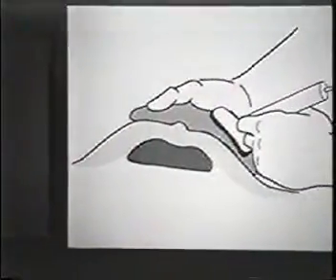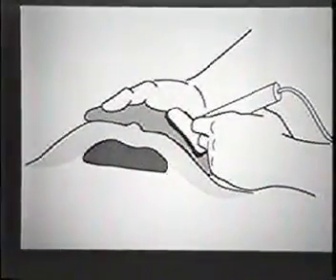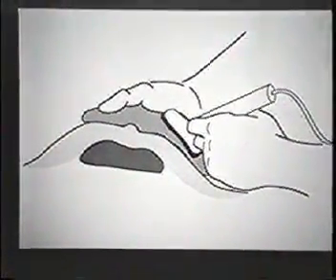Let me just show you what some of those normals look like. This is a normal implant at sonography. This is the normal tissue anterior to the implant. Here's fat and fibroglandular tissue. And here's the very sharp implant shell, the border of it, or the fibrous capsule, and the implant shell below it, and here's the anechoic interior, which is normal. Again, a fluid offset may be necessary to see any abnormalities anterior to the implant because of the fact that these will be very superficial.